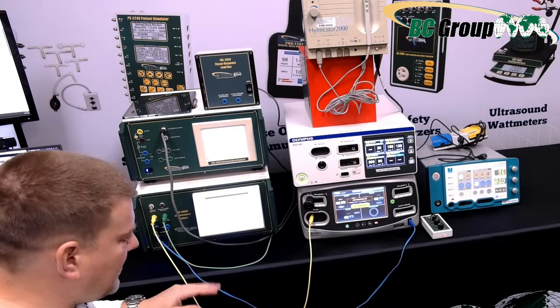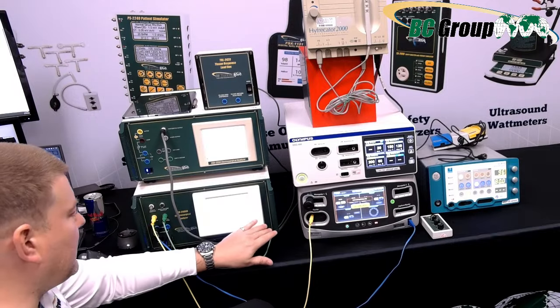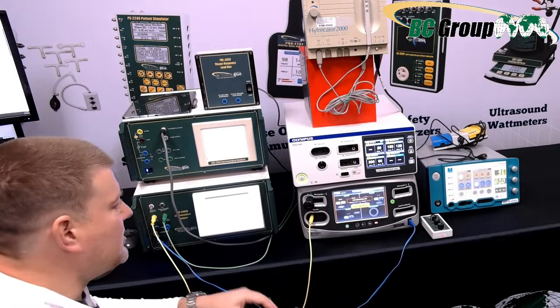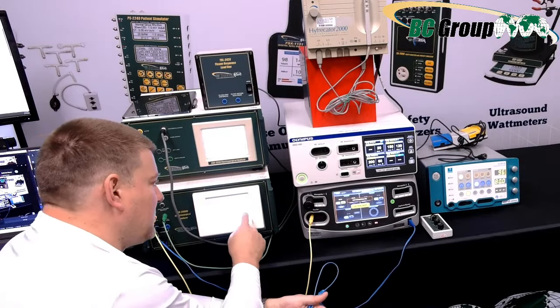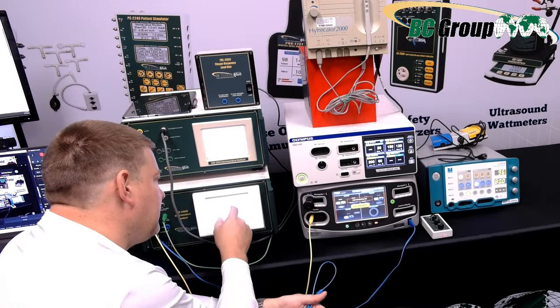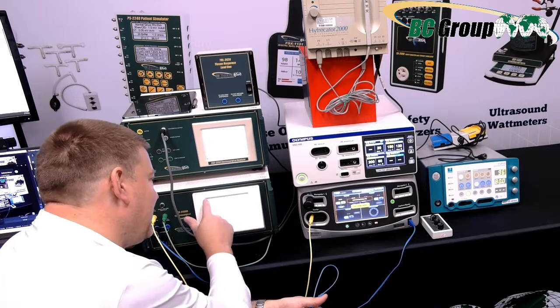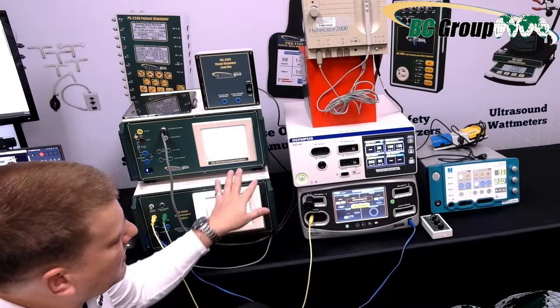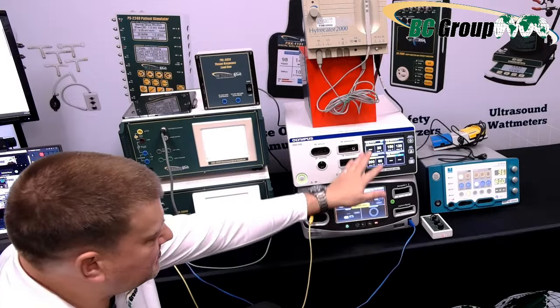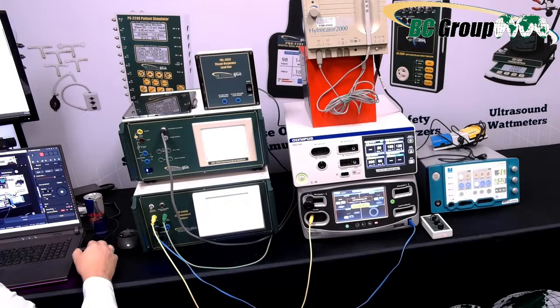I have just a couple different cables, and I'm going to be doing most of my demonstration over here on the ESU-2400. I am going to zoom you guys in. A lot of this is going to get a little bit darker because the screens on these guys are very bright, and since they're very bright, it's just not liking it for a camera. It's so difficult for the camera to pick up the screens. This guy over here is picking up just fine, but this guy right here, not so much. So let's go ahead and zoom you guys in.